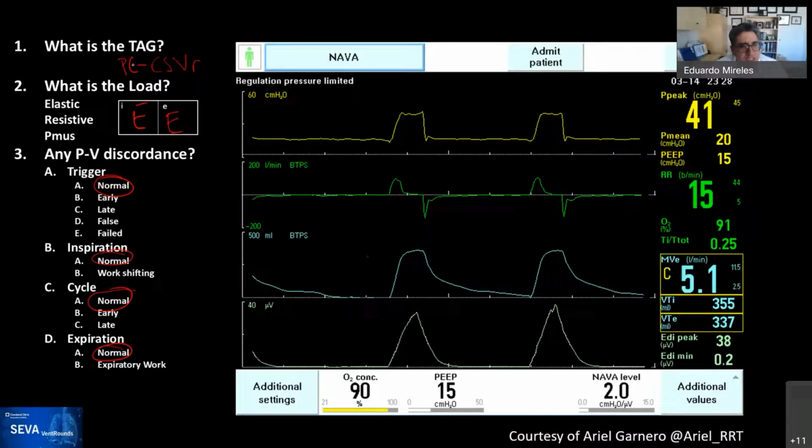So we agree this is pressure control. This is CSV, so continuous spontaneous ventilation, which is servo. And without a doubt, if the patient stops breathing, he would get now pressure controlled breaths to rescue or to maintain them. So in a sense, that's an IMV. But I guess that is the primary. Our Rosetta card calls it IMV.